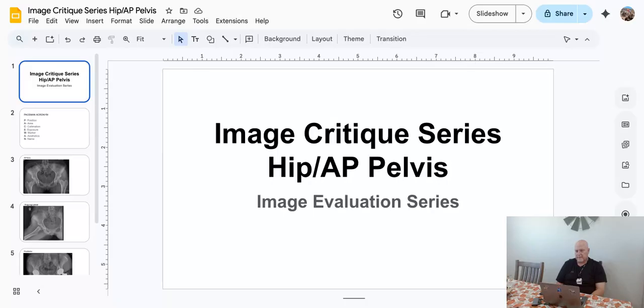The biggest issue that I see is that images aren't annotated correctly. Toes are pointed down, or fingers are pointed down, or images are inverted. Just pay attention to that. If you ever have any questions, just reach out, and I can help you with that.